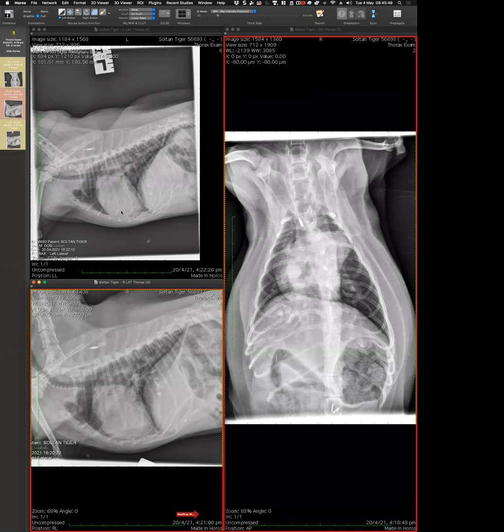Okay. Hang on, I'll just unmute it. So this fits, and I remember after my first excitement about heartworm, I then said, well, actually, I take it back. This is a pulmonary hypertension case. Then we need to explore why. And when someone said, oh, PDA, I said, okay, that's it. Then there's no more to investigate. This is a chronic PDA with pulmonary hypertension.